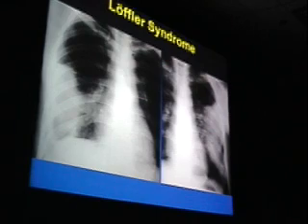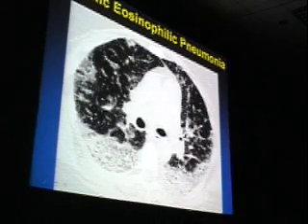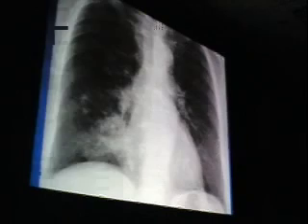clinically or radiographically. Now, this was a patient with more of a chronic relapsing course with upper lobe opacities. They're peripheral, as you can see here on the CT, and another case from earlier in the high-resolution CT talk, a patient with eosinophilic pneumonia. Again, this was eventually thought to be due to ibuprofen use.